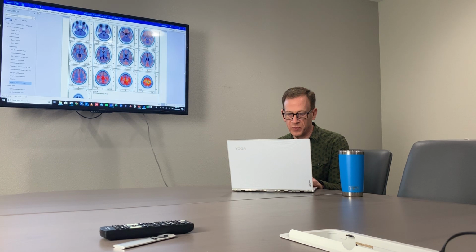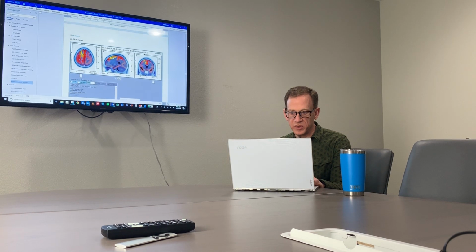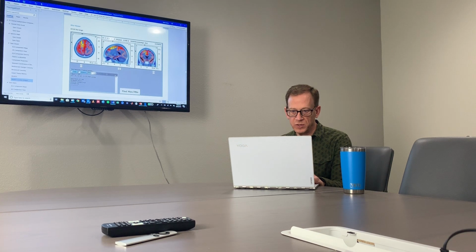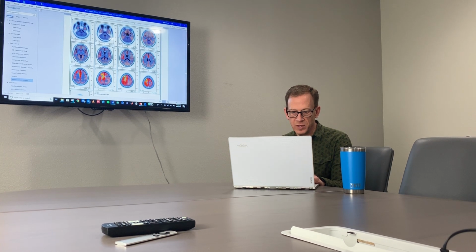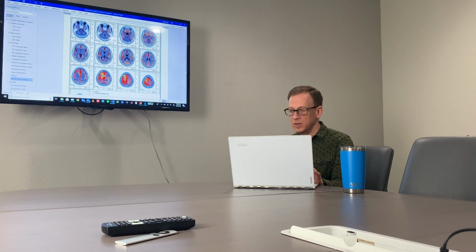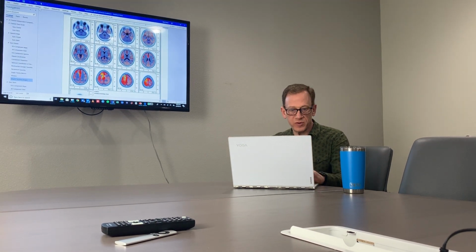This shows you some other pictures of it and the areas affected. And then from 22 to 24 hertz, again up over the frontal lobes, you can see that peak activity and where it's coming from right up there. So if we were designing their neurofeedback protocol, then we would want to incorporate those middle portions of the frontal lobes and combine them.